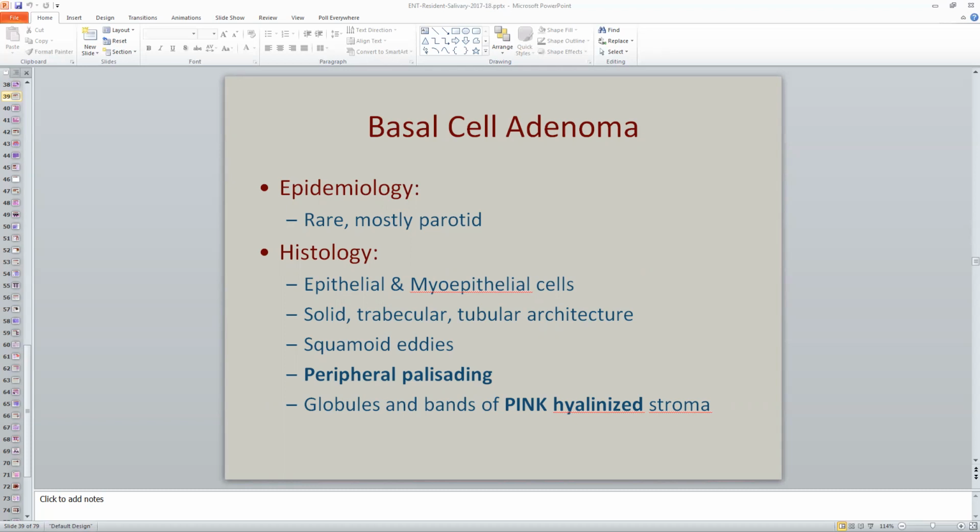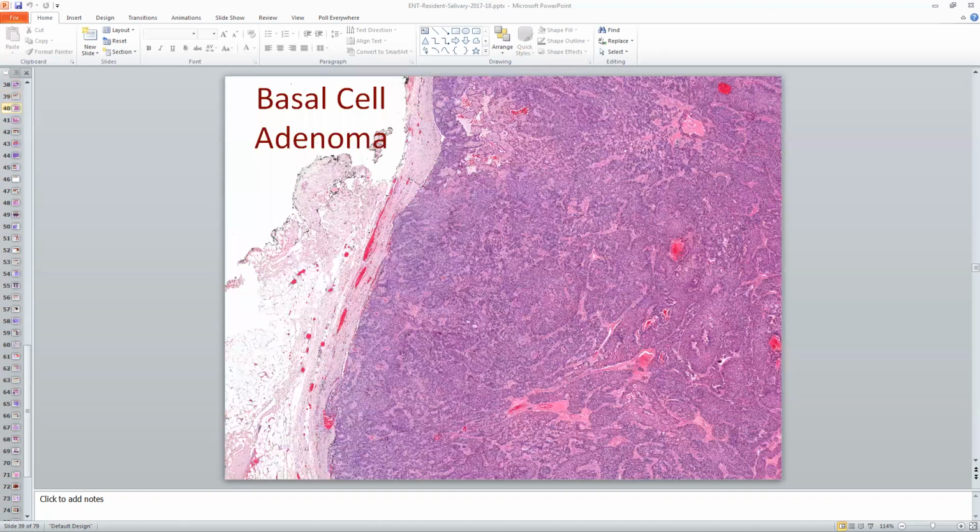basal cell carcinoma like of the skin, right? Basal cell carcinoma of the skin is basal to us as pathologists just means it looks very blue and primitive, and it doesn't have a lot of cytoplasm, so it doesn't really look very pink on histology. It looks very blue and so-called basaloid. So basal cell neoplasms of salivary and basal cell carcinomas of skin all do look very blue, but they arise differently, right? The skin arises from the basal, derived tissues of the epidermis, and basal cell adenomas and basal cell adenocarcinomas are of the glandular cells of the salivary. And so how they look are as such.